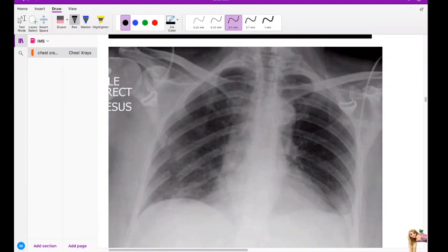Okay, so basically, this rib over here is fractured, this rib over here is fractured, and this rib over here is fractured. Can you guys see that? If three contiguous ribs are fractured, one portion of the thoracic cavity gets disconnected, it does not move in coordination with the rest of the chest. So there's paradoxical motion of that chest upon breathing. It collapses inwards instead of going outwards. That is called flail chest. It can lead to respiratory distress, tachypnea, and shallow breathing. So that is basically what flail chest is, all right? You guys got that?